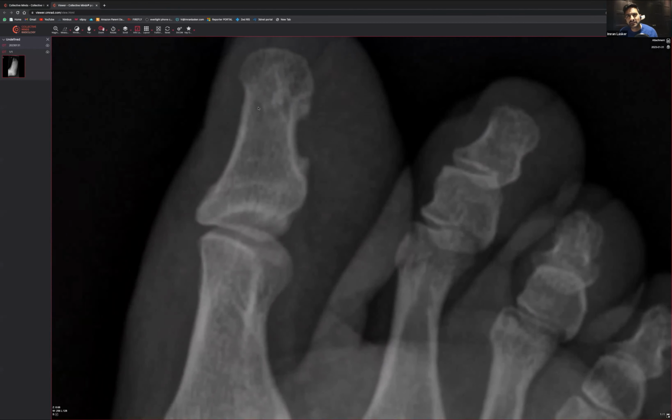let's have a look. Terminal tuft actually looks okay. Is that overlap of the bone? Yeah, I mean the nail, I would actually say so. Okay, so terminal tuft, people coming out with the answers. Good. Okay, so that doesn't look quite right, does it, over there?